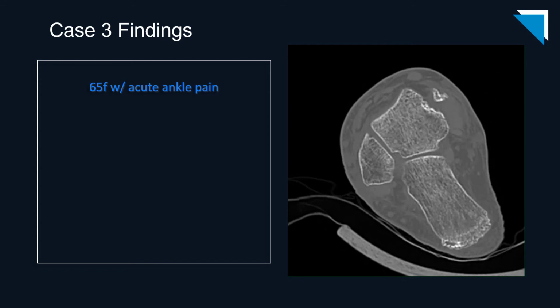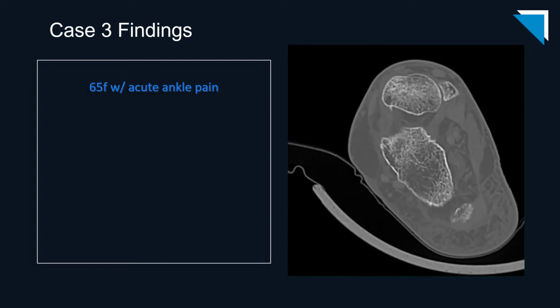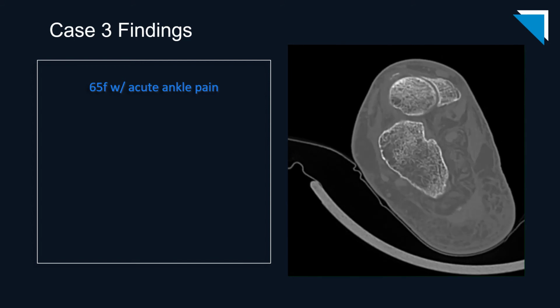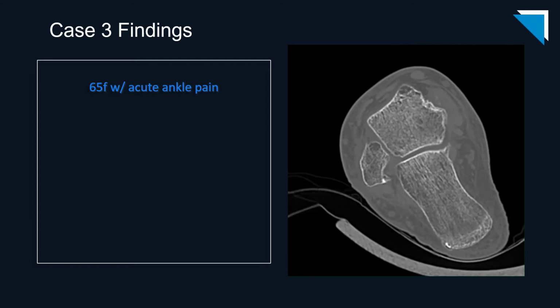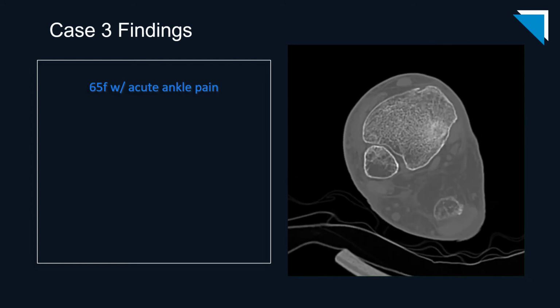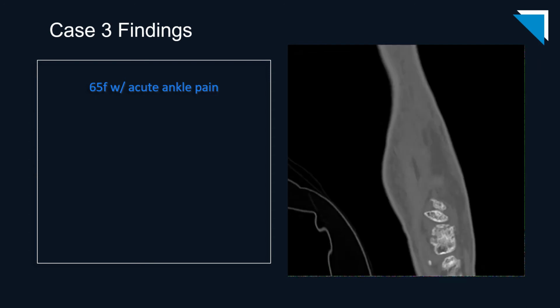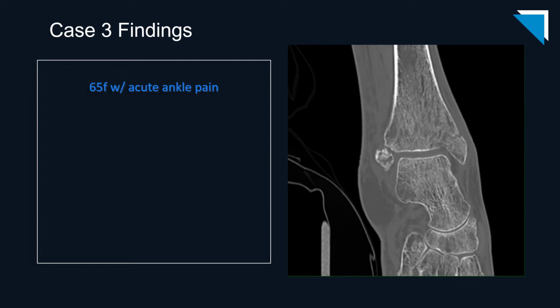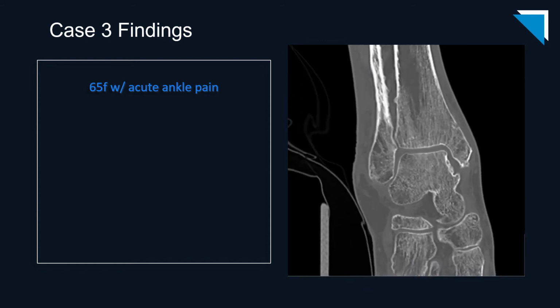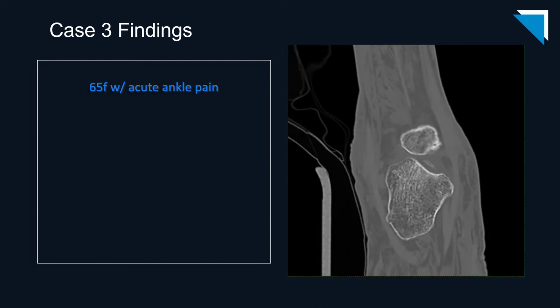The patient has pronounced osteopenia, which makes identifying fractures a little bit more difficult, but I think at least one of the findings should be clearly evident to you even on a first look. These are the coronal images from the same study. Once again, I think the major findings should be fairly obvious to you, although the osteopenia does make it somewhat more difficult.